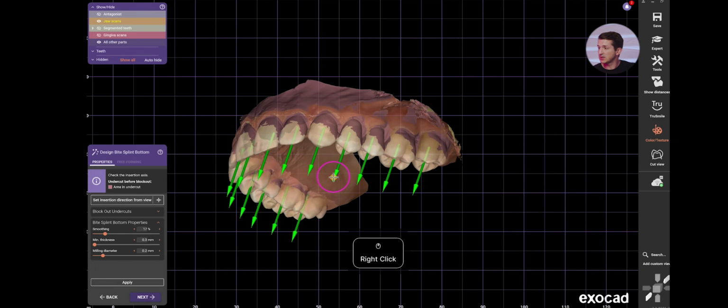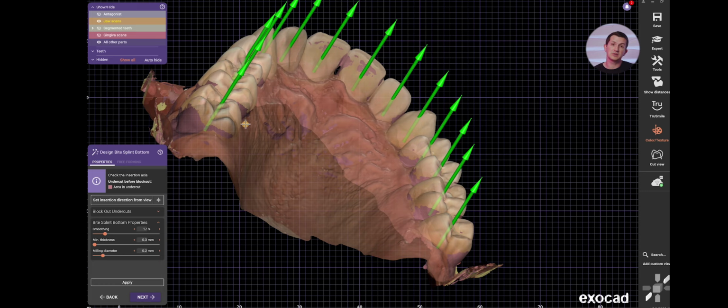The other thing to notice here is particularly on this number 2, this patient has blockout that's applied essentially circumferentially around this back side of this tooth. What does that mean? If we draw our border appliance over this, there will be space between that tooth and the appliance when you go to deliver it. It doesn't mean that 3D printing is not good or inaccurate. It doesn't mean that digital design is not good or inaccurate. It means that we need that amount of block out there to be able to deliver this appliance predictably.